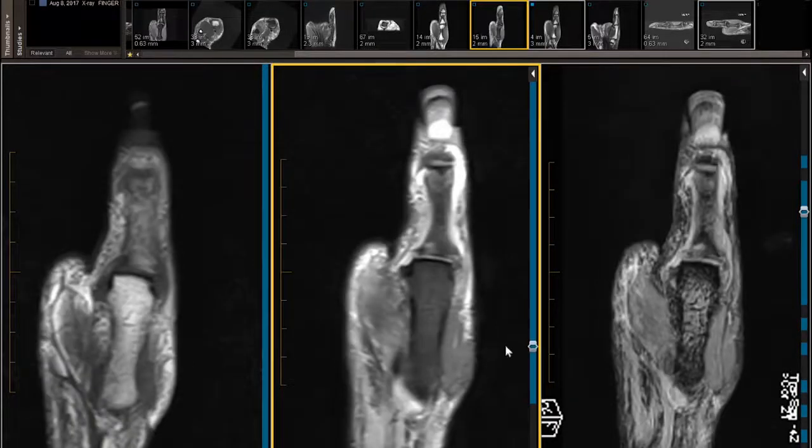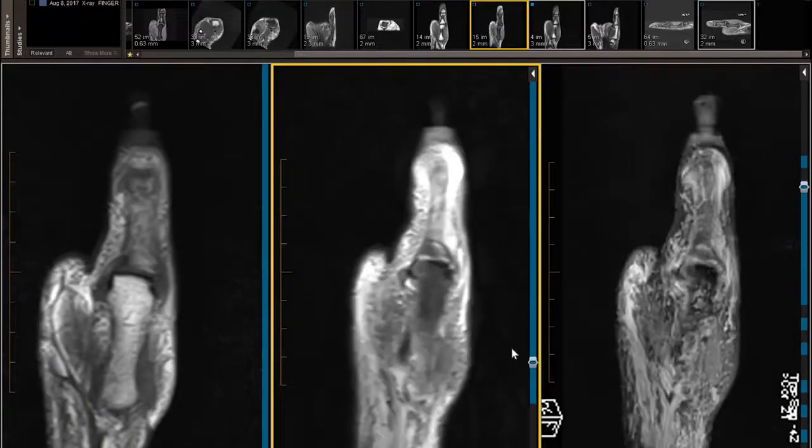We go dorsally, and there is our structure, our UCL, right there, sticking out medially, and it should not be present perpendicular to the axis of the proximal phalanx and the metacarpal. It's sticking straight out towards the adductors. We are on the most dorsal aspect of the thumb. So an exaggerated appearance of our lollipop sign in the dorsum of the thumb.